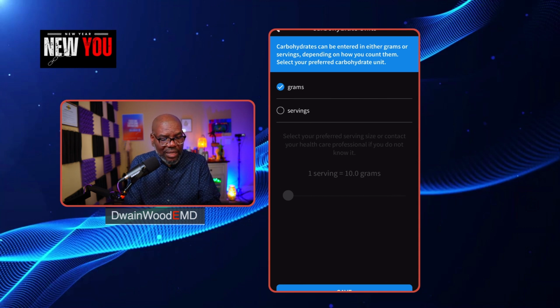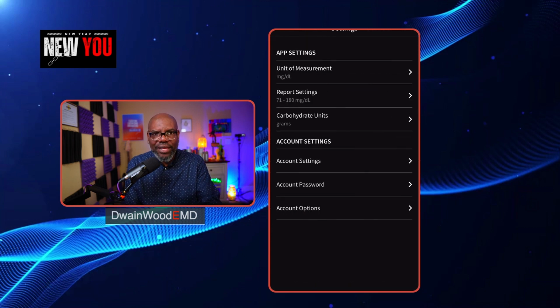Now you could change that down here at the bottom. Like if I say servings, I can tell it how many grams I want one serving to be, right? And the convention is that it's actually 15. Right? I just like grams, so that's what I talk in. But I think in 15s. When I'm talking to people, I use grams of carbs per serving, but in my head I'm actually converting it, right?